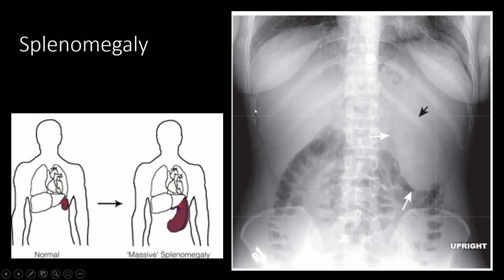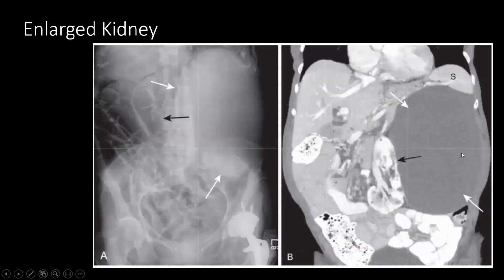Okay, as you can see, how did I determine the liver edge here? Because I have this peritoneal fat that is giving me a distinguished liver edge that I can see here, and the liver border here that I can appreciate. That's why I can determine that, yes, this is the liver shade, and below it, this is the pattern of the large bowel, because it has air in. So this is regarding the splenomegaly.